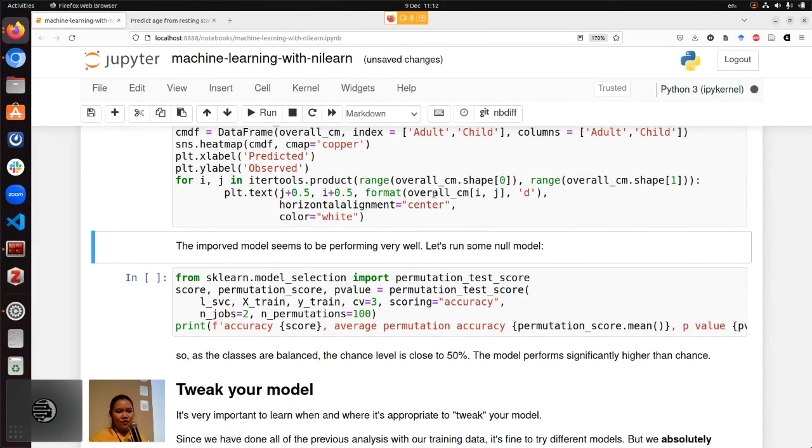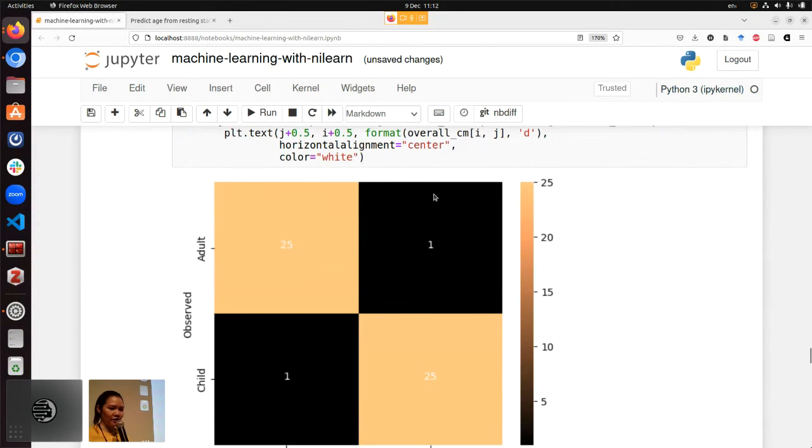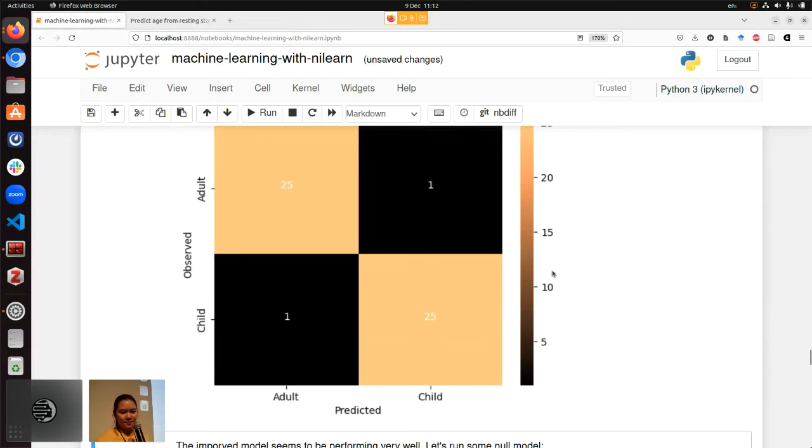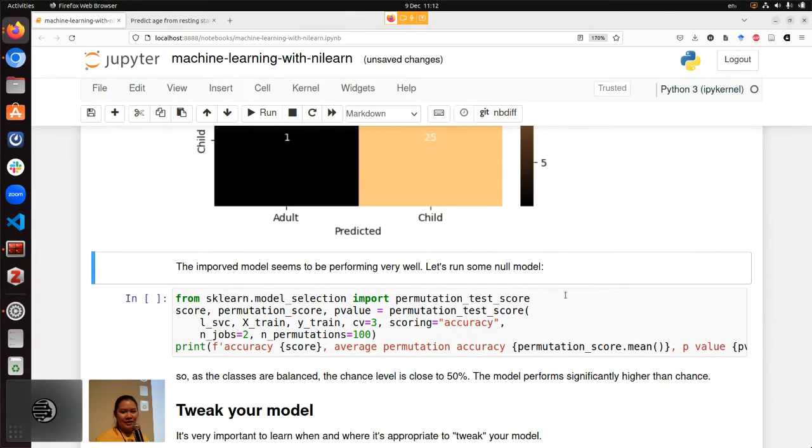For the same thing, you can calculate a confusion matrix just to see how that distributes in this cross-validated version of the model. So we don't see a perfect prediction. This is usually a good case.